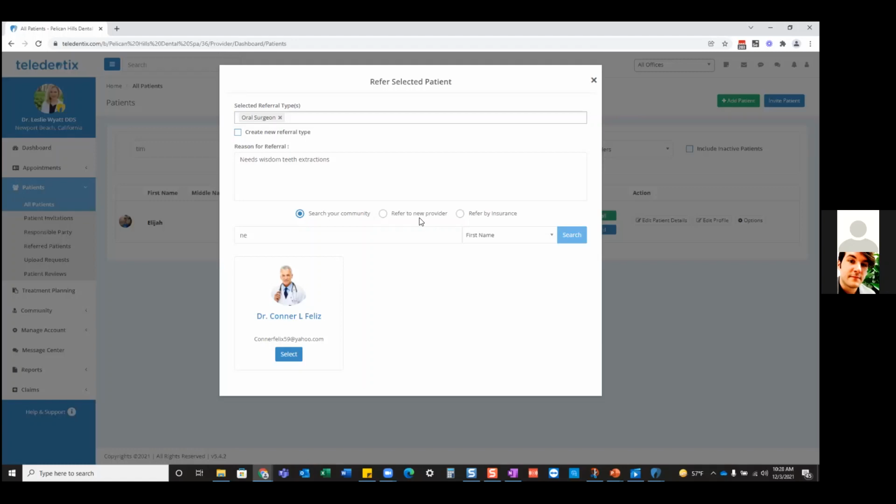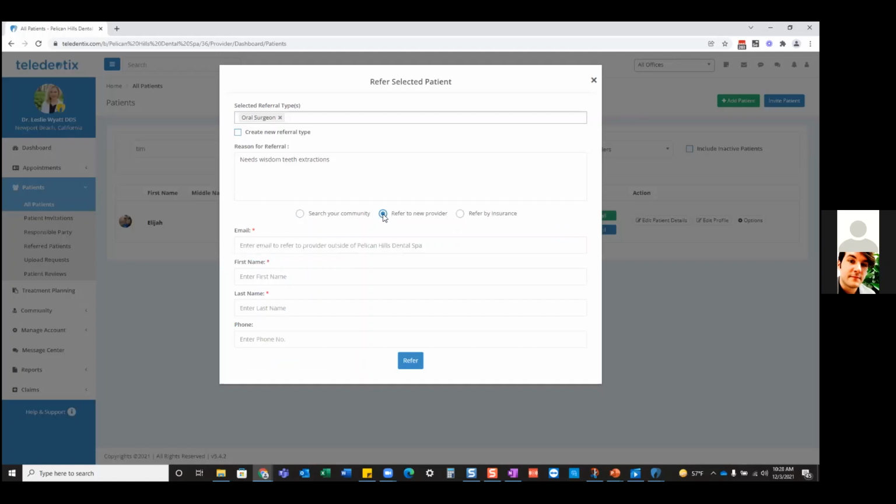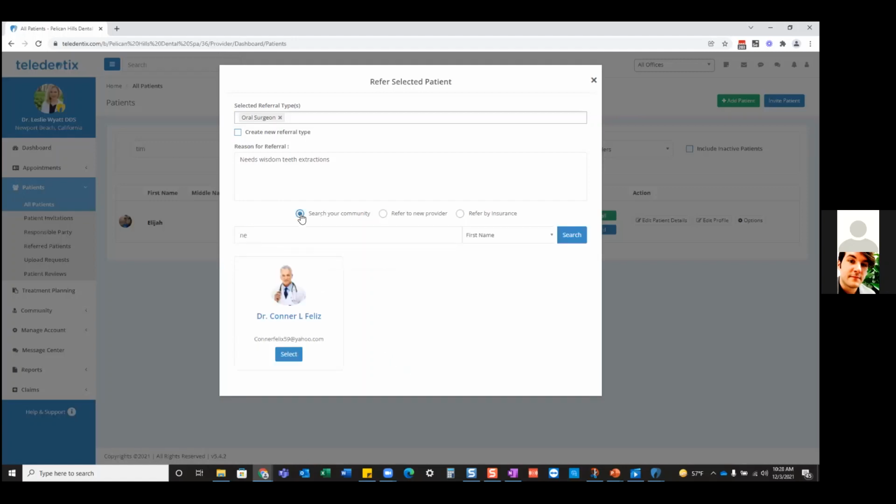So if you know Dr. Lee from down the street, he's an amazing oral surgeon, but he's not using Teledentix, that's okay. I can go ahead and still refer to a brand new provider. All I'm going to need for that is email, first name, last name, and phone number. And I can go ahead and refer. Now, that is going to prompt Dr. Lee to go through a really quick and easy registration. I'm talking quick and easy, like a minute.